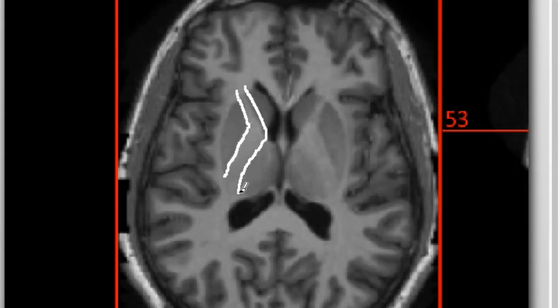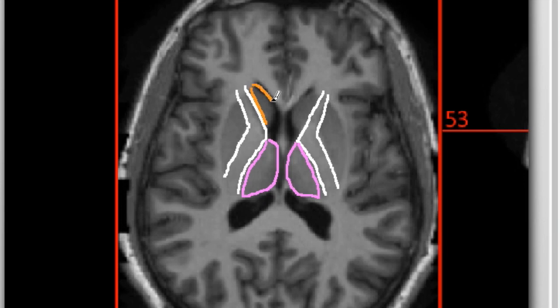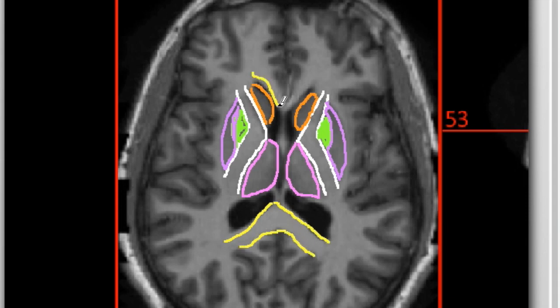To recap, we start off in the midline with the thalamus and caudate nuclei, medial to the internal capsule's anterior limb, genu, and posterior limb, with the genu and posterior limb carrying our voluntary motor tracts. Then laterally, we have the lentiform nuclei, globus pallidus, interna and externa, and the putamen. We have collectively the basal ganglia and thalamus playing their roles in regulating voluntary muscle movement. And finally, for completion's sake, the parts of corpus callosum seen are the splenium posteriorly and the rostrum anteriorly.